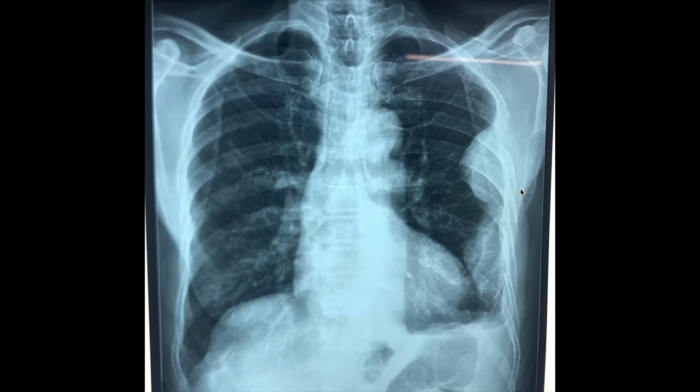The chest X-ray of a person in erect position, posterior anterior view, and the exposure is good, and it is a little bit rotated to the left side because the spinous process is toward the left head of the left clavicle compared to the right. What we see here is opacities in the pleural margin, and they are rounded opacities in the left pleural margin, and there are 2 of them, opacities that are seen in the mediastinum.